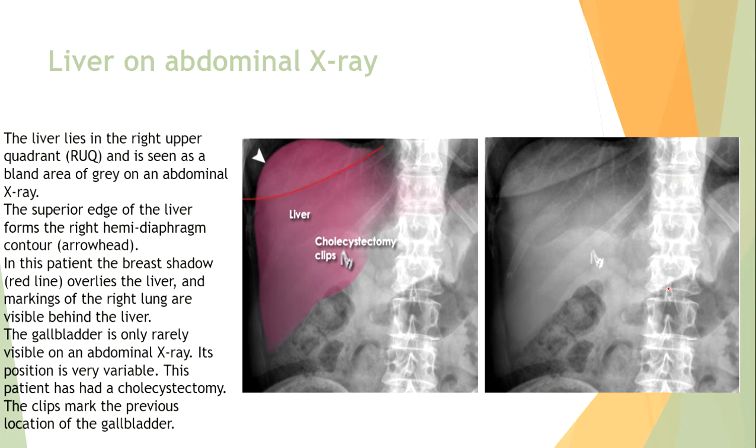Its position is very variable. This patient had a cholecystectomy. The clips mark the previous location of the gallbladder.